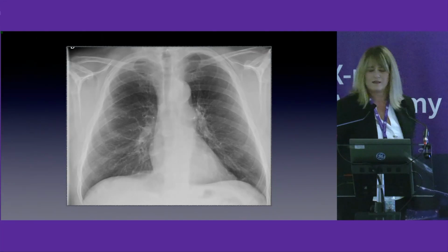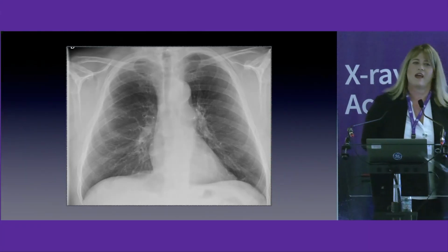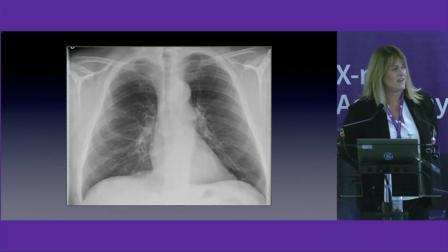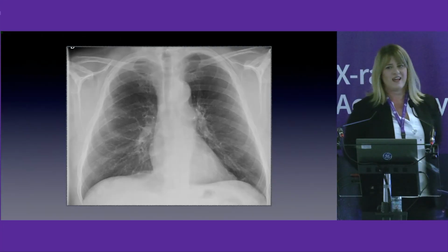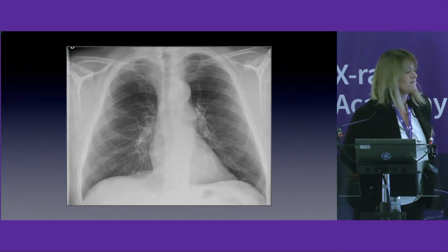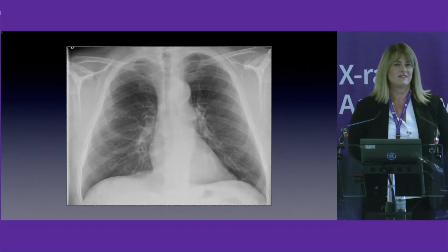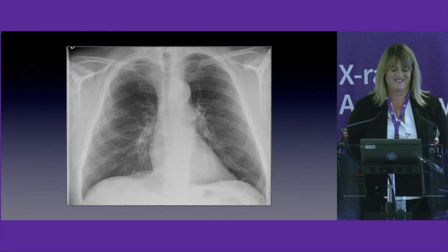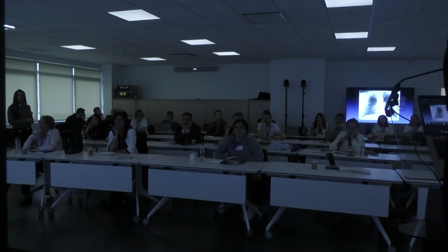And what about this? Is everything okay? Or maybe something? There's a fracture there, I don't know. A fracture. Well? Upper right side. Okay, anyone else? Any other idea or comment? Oh, and maybe there is a low density nodule on the left, on the right.